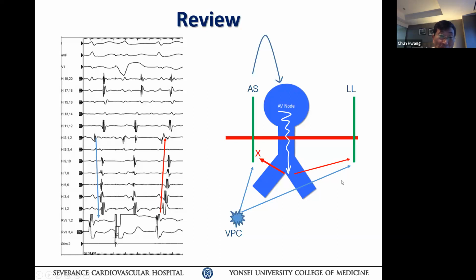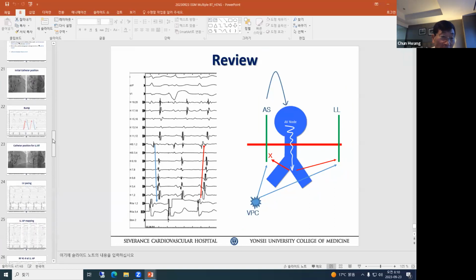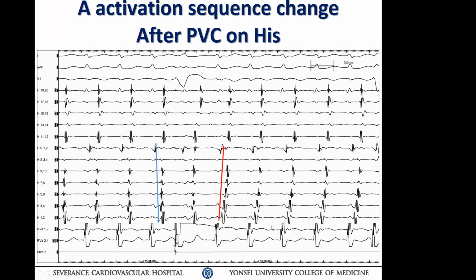No, I don't need to know your explanation. I need to see that slide that you showed me. The tachycardia tracing, the tracing of tachycardia that you reset. Yeah, that's the one. This is the one.